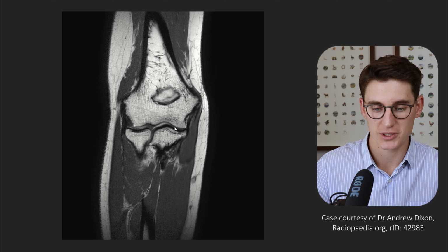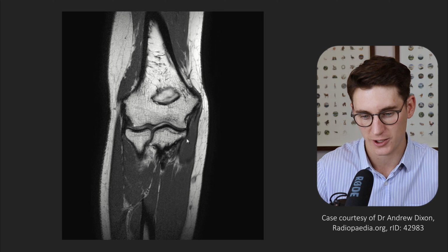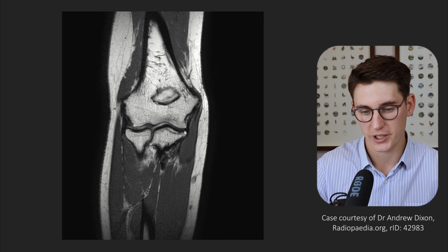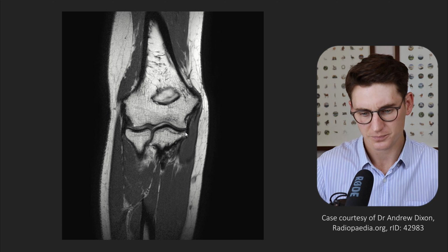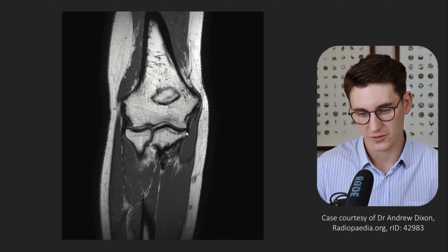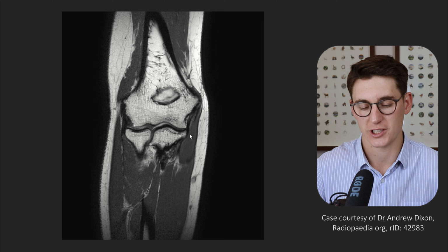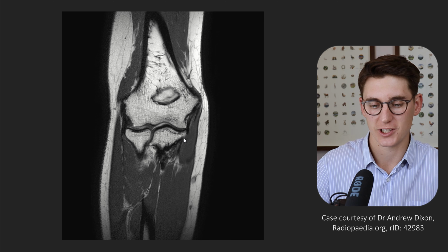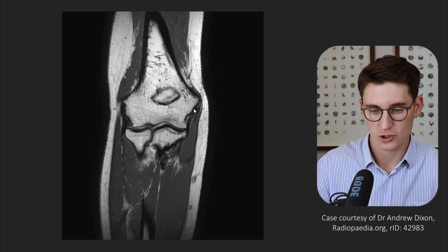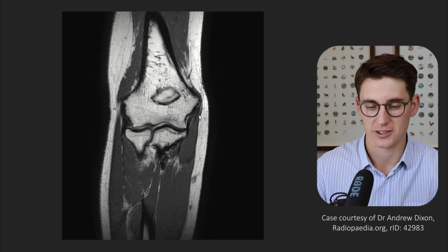We've got lateral ligaments and we've got medial ligaments. I'm going to start on the medial side because it's a little bit more simple and we're at the right position to have a look at this ligament. You can see the coronoid process here of the ulnar bone, and this most medial little bit here is what's known as our sublime tubercle, and that's what gives rise to the anterior band of our ulnar collateral ligament. The ulnar collateral ligament comes from the ulna and heads off towards the medial epicondyle here. It actually inserts just below that common flexor tendon here.